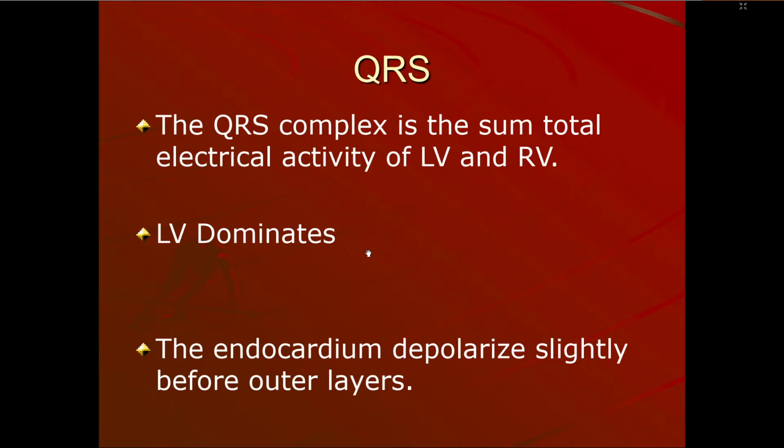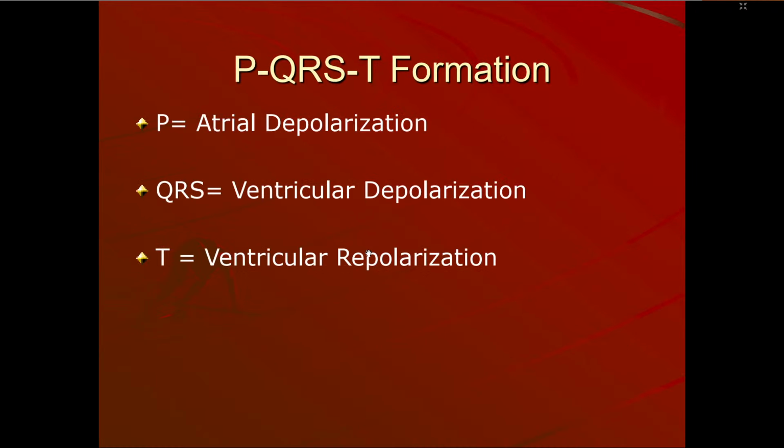But in that case, the impulse is going away from V1, V2. So you will get a deep S in V1, V2 when we are talking about the left ventricle. Okay. So everything here is important from the exam point of view.